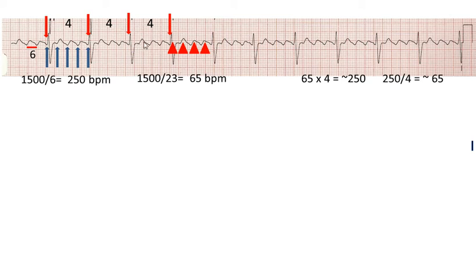Here's the next one, a little taller than these two because there's also a T wave here, so the voltage adds up a little bit to make a little bit of a taller flutter wave there with the T in the middle of it. Here's another flutter and another flutter. There's one hiding under the QRS, partially obscured by the T wave, another one, another one.